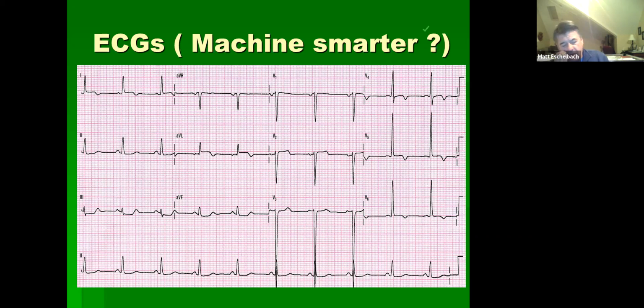What I'm gonna tell you is the EKG machine says consider MI. It's 2 o'clock in the morning, you're tired, you're looking at this EKG, and the EKG machine is telling you to consider acute MI. Now you got to talk yourself in or out of it. So let's talk myself out of it. It looks more like ischemia.